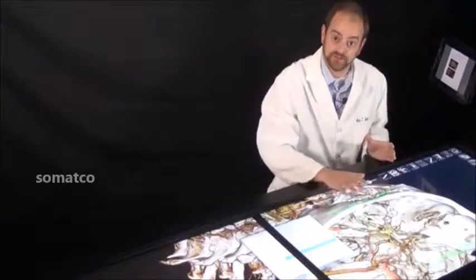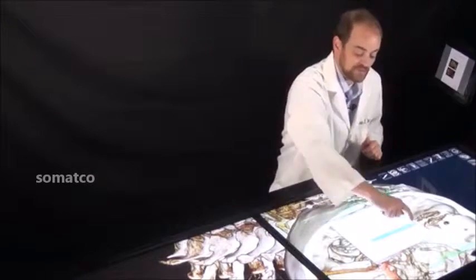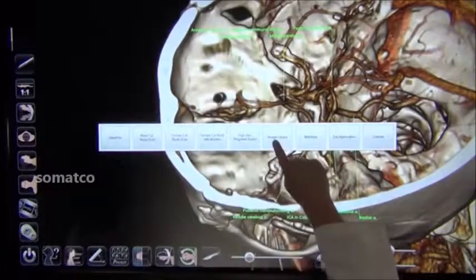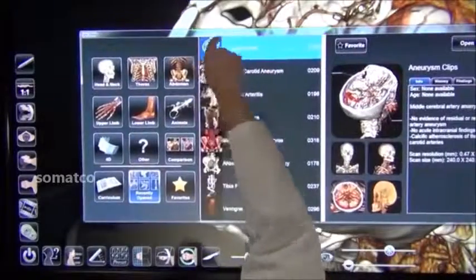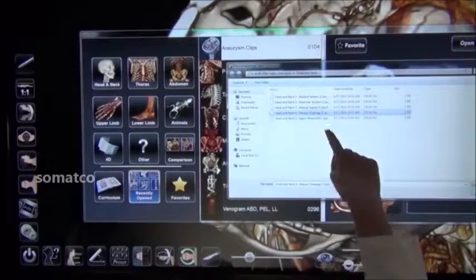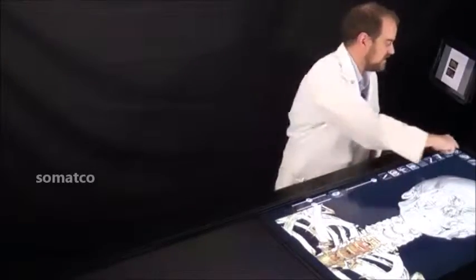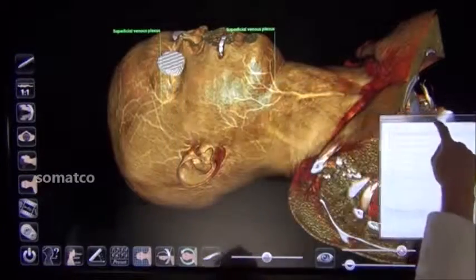After having completed the demonstration of the arterial supply to the head and neck, you could continue the discussion by talking about the venous drainage. To do so, we will again select from the power icon the image library, scroll, select the curriculum file, and now move on to number 4, venous drainage of the head and neck. With the venous drainage for the head and neck, a new case will be displayed. Again, select the film icon to begin playing the view sequence.